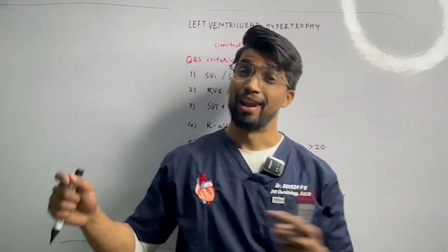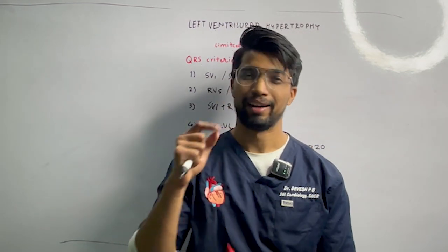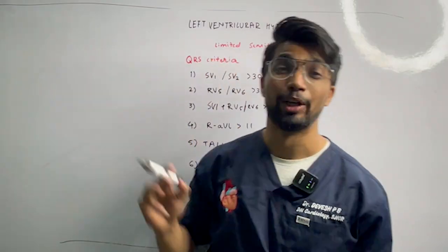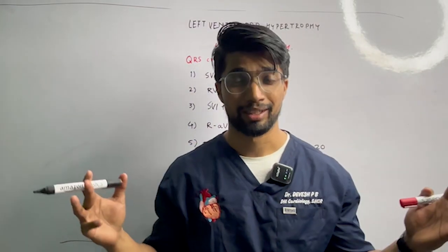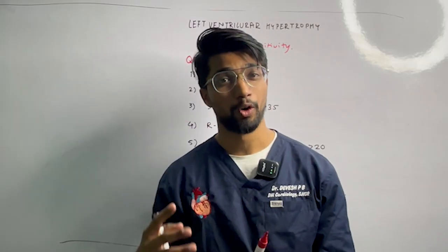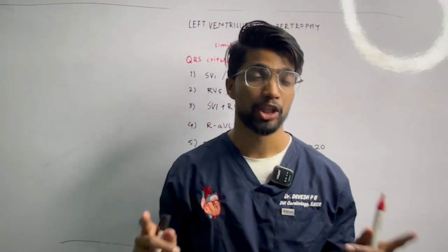Hello everyone. Last time, we spoke about atrial enlargement, and now we move on to hypertrophy. Hypertrophy is a term that we particularly use when it comes to ventricles, and because ventricles are muscular, they undergo muscle hypertrophy more than enlargement.